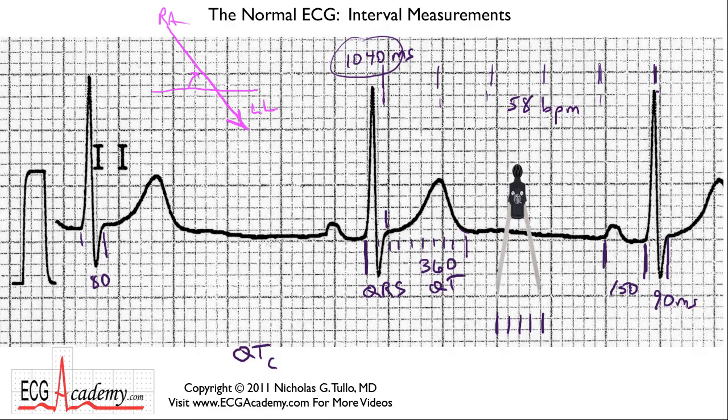I think a quick and easy way for people to get a sense of whether the QT is in the normal range is that the T wave should not really extend past the midpoint between two QRS complexes. So if you look at these two QRS complexes and you figure the midpoint is around here someplace, clearly this T wave ends on time and it's not prolonged. Certain medical conditions can cause the QT interval to become prolonged, and there's even a condition known as congenital long QT syndrome that we'll talk about in the advanced course as well. And one of the ways to diagnose that is to just measure the corrected QT interval.